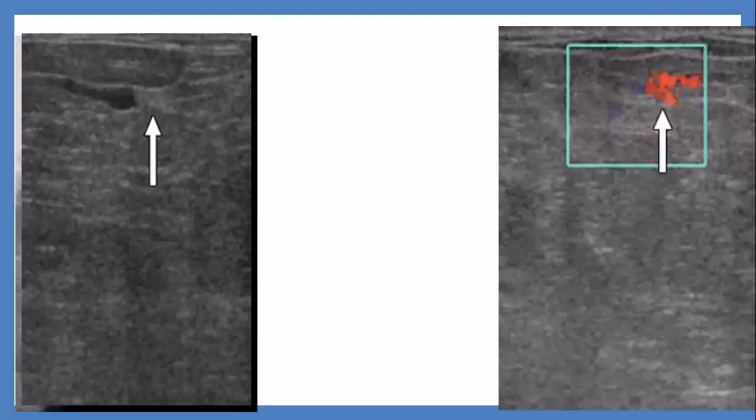So we are talking about what could be a papilloma. First, we are talking about an intraductal soft tissue mass, or intraductal enhancing soft tissue lesions. Then we go for the differential. Yes, you are right. Papilloma is the commonest among the differential diagnoses, so we have to go for tissue diagnosis.